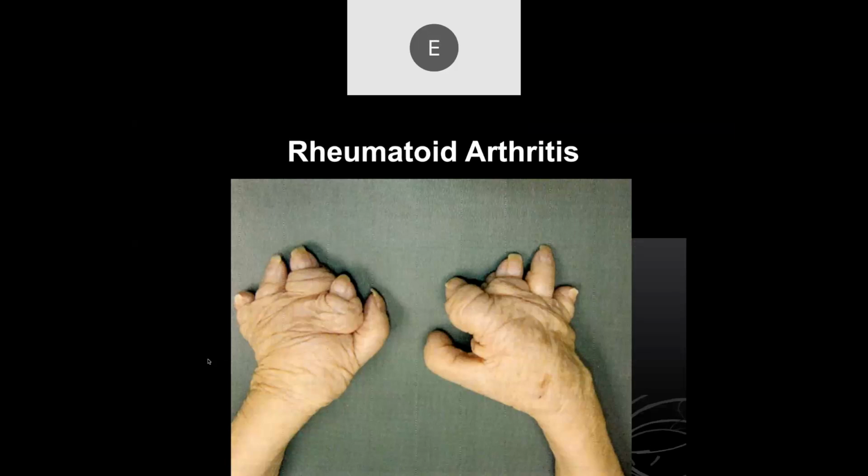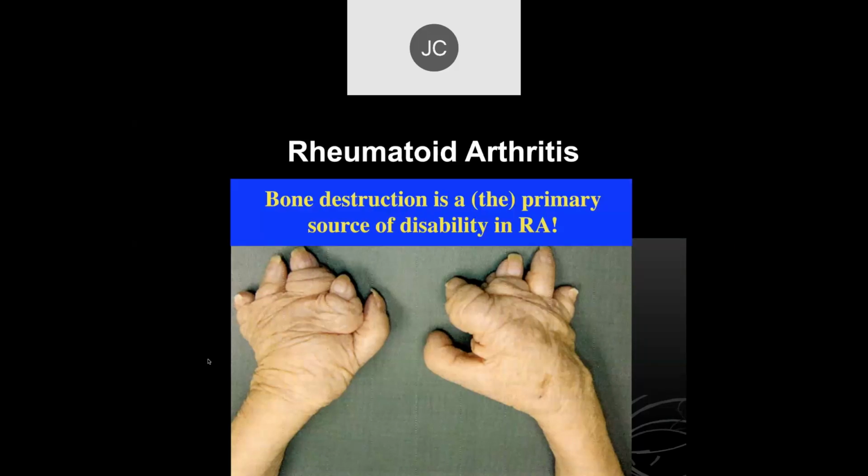Okay. Well, why don't we move on to rheumatoid arthritis? So this is what end-stage rheumatoid arthritis used to look like, with marked bony destruction. And obviously these hands are not functional. So it's something we want to make sure we now, with effective treatment, treat much earlier than this, before you have all these irreversible changes.